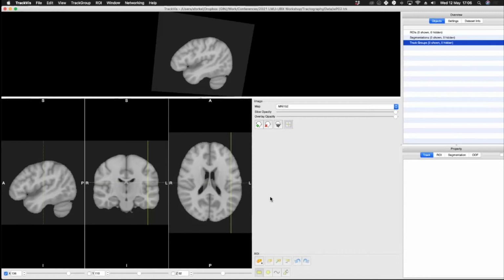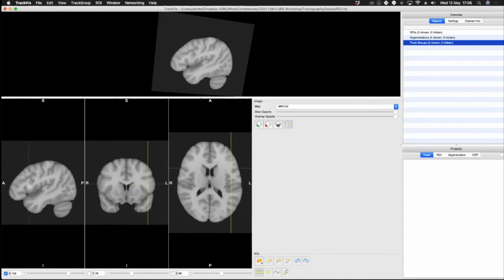Right, so because we're now going to try and segment the three segments, there's various different ways of doing it. When we started, you had to draw all the regions on axial slices, and you had to go through every single slice to draw your region of interest. In the more recent iterations of the software, you also have what is known as spheres, which greatly improves that work.